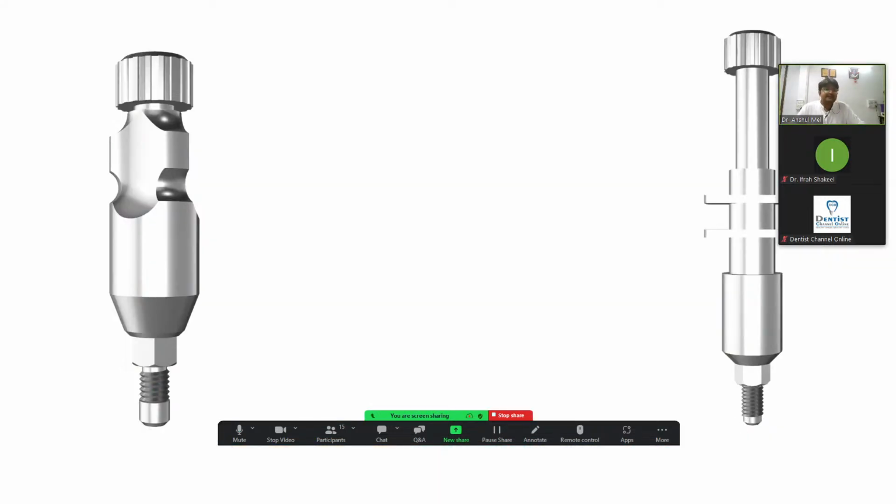So before starting the prosthetic work, if I ask the first question, from where do you start digital dentistry in implantology? Everyone says from taking the impression, and then digital starts. But to me, it is before placement of the implant. First, you send the patient for a CBCT, or you take an IOPA or OPG.